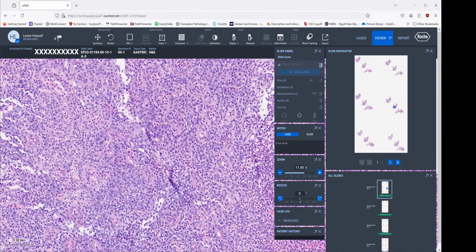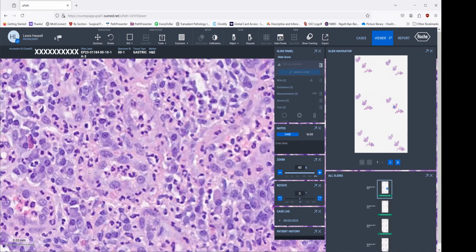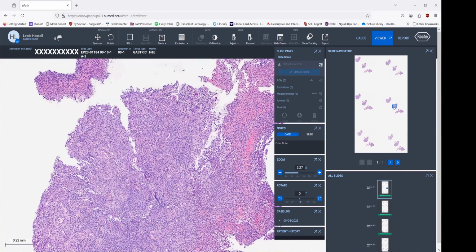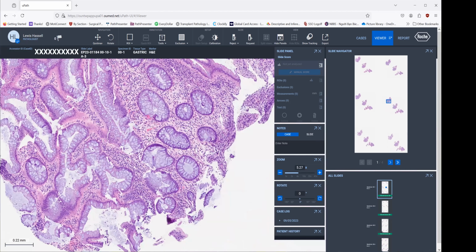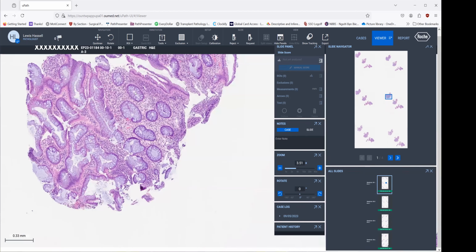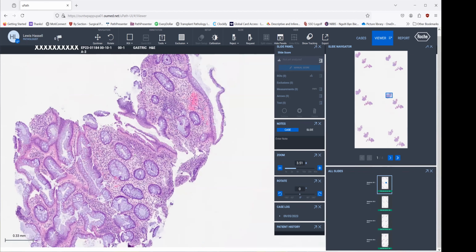And these other rounded structures sometimes can look like glands, but are actually very nice endothelial-lined structures, the granulation tissue type vessels. So why does she have a very dense lymphoplasmacytic infiltration? And then she has this very exuberant sort of foveolar cell hyperplasia going on.